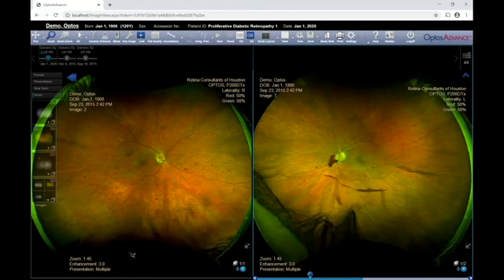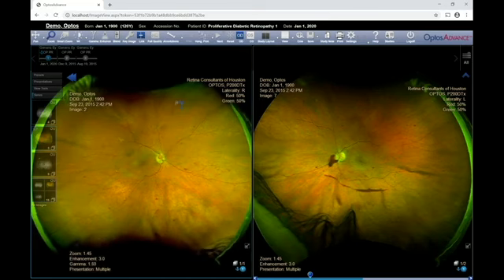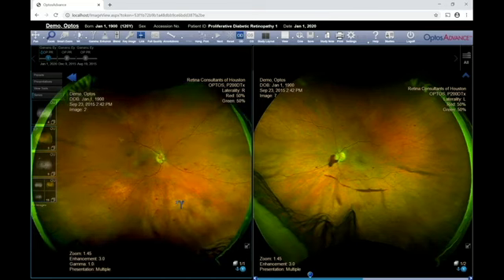You may adjust the gamma or image brightness by depressing the scroll wheel and moving the mouse towards the screen to make the image brighter, or away from the screen to make the image darker. Gamma levels are displayed at the bottom left of the image viewport.